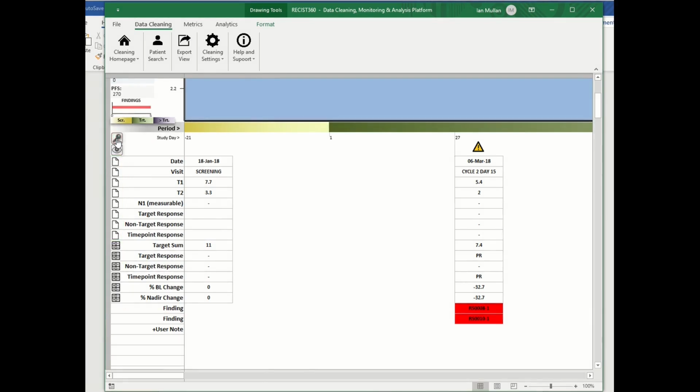Lesion information is displayed using respective CRF identification codes. However, using the lesion display toggle switch, we can understand both the lesion location in addition to the scan methods used. There is quite naturally a lot of information displayed to the end user. This information is required for the program to identify data discrepancies, but it doesn't mean the end user has to see all of it. We will see how to hide some of this noise shortly.